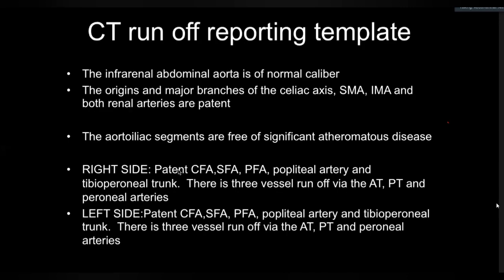And then the lower limb. So if the vessels are patent, so patent common femoral, SFA, profundifemoral artery, popliteal artery, and tibioperoneal trunk. Are the vessels patent? And if they're not patent, are they occluded? That means no contrast, or they're stenosed.